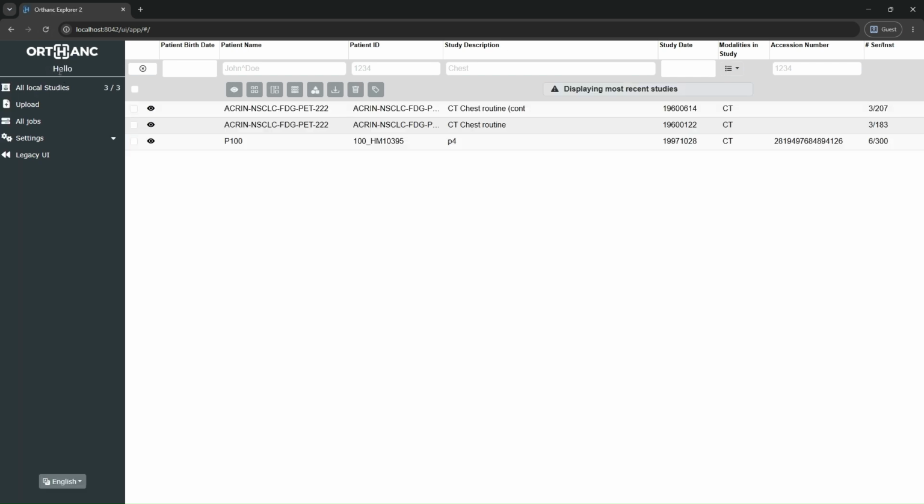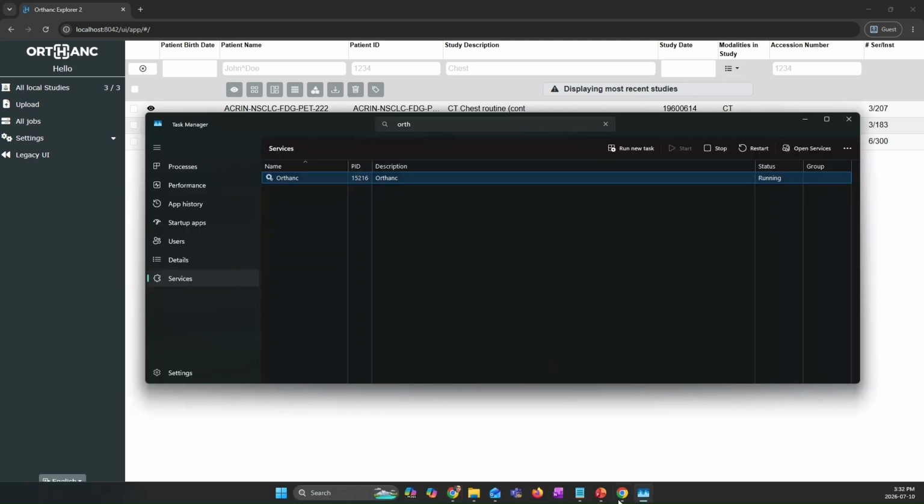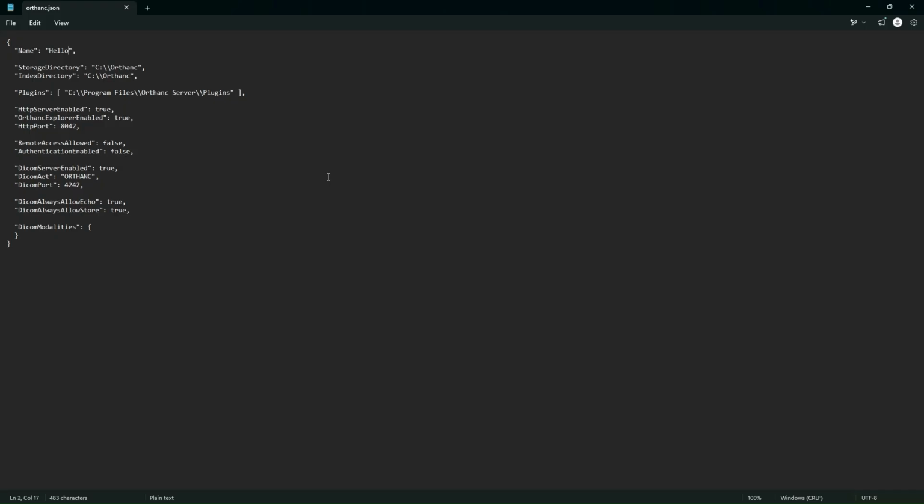Our configuration has gone in. Hello is the new config that we have out here that we've just put in. All right, so that's great. Let's keep going. Let's try to, oops, and it helps to open something useful here. And let's try to understand what other configuration we can do out here.